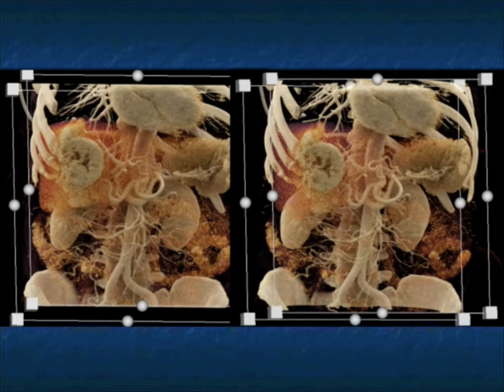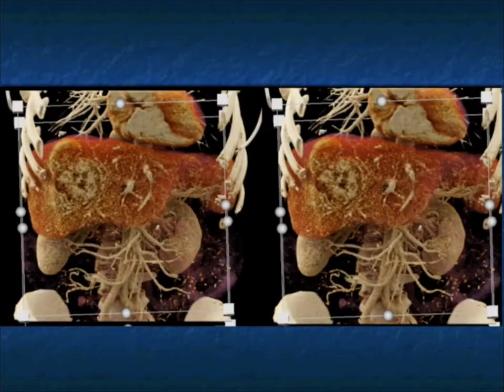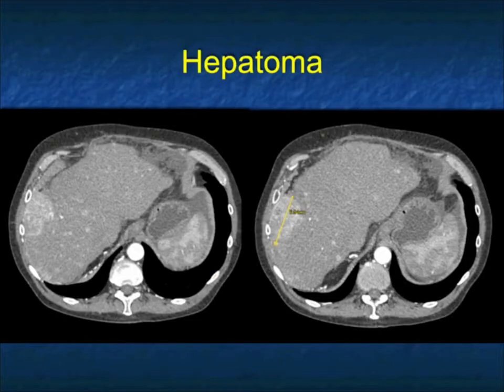We also can look at the texture and enhancement of the lesion and perhaps have some prediction based on that as well. The idea about texture mapping and radiomics is something I'll touch on at the end of this talk, but it's something that people are using as well. Again, it helps with preoperative planning, management, decision-making, and also in differential diagnosis, perhaps this will help us in more difficult cases.